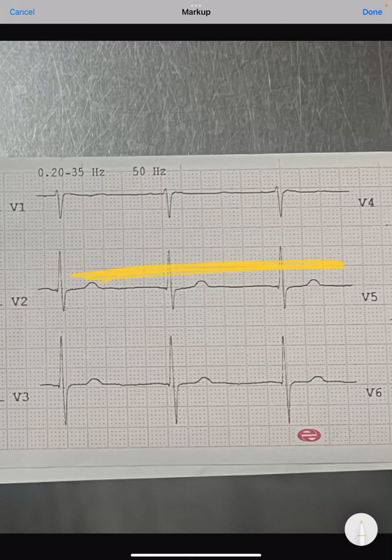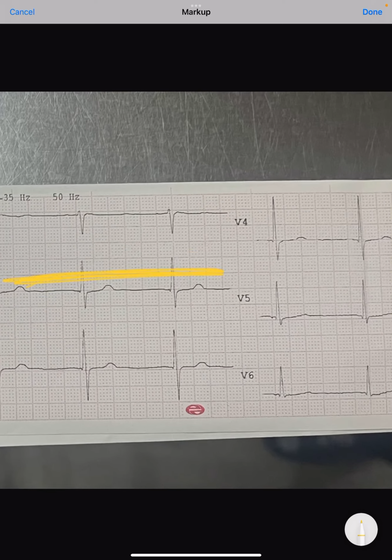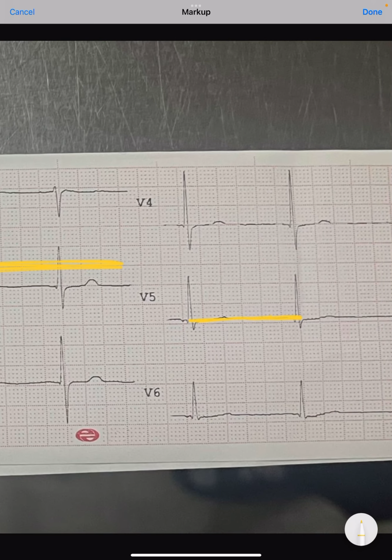So in this particular ECG, the P is prominent and the QRS is very prominent, but the T is apparent only in 3 leads out of the 12 leads. In all the other 9 leads, the T wave is almost flattened. The next thing is, if the potassium worsens, or if there is worsening of the hypokalemia, then there will be T wave inversion, and after that the patient will have ST depression. Those are very typical changes if the potassium keeps on worsening.